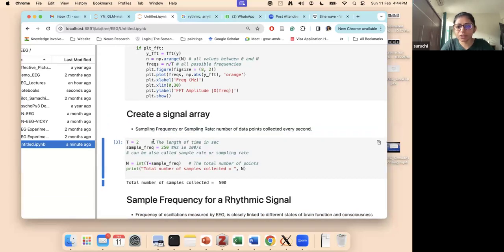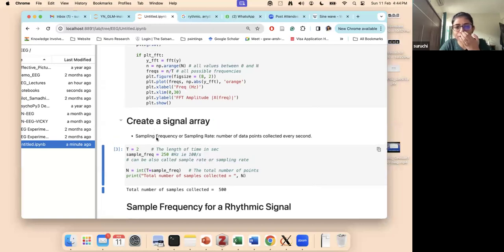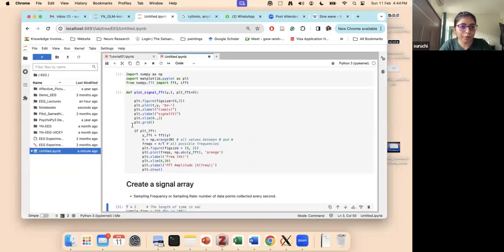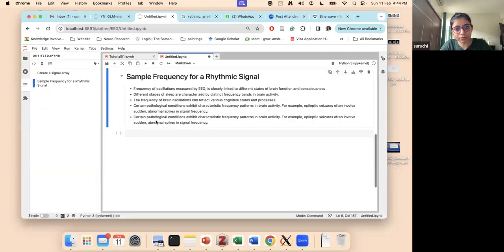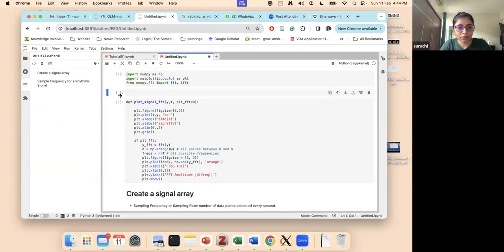See, it's pretty decent. You can do the headings. In fact, it creates a table for you to navigate. If it's becoming very long, you can just click here and go to that or that, right? Put a heading for this also.